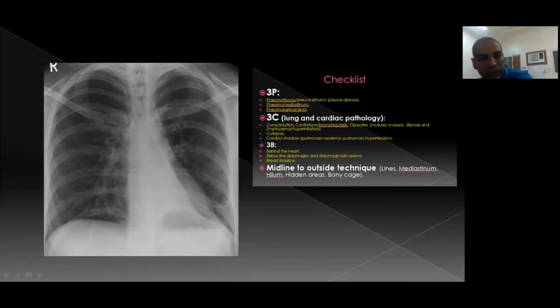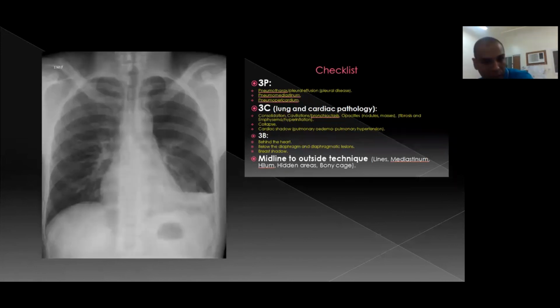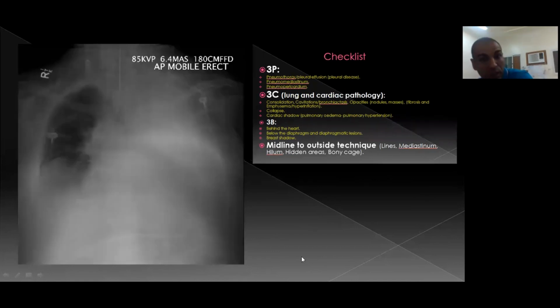Thank you, Dr. Wael. I think this one is similar to what we discussed before. We have here jet black, and we have here hydropneumothorax, but it is not tension hydropneumothorax because we don't have any mass effect, no mediastinal shift, no diaphragmatic displacement. This one, I think we discussed, or we have a similar case. This is a malpositioned endotracheal tube.